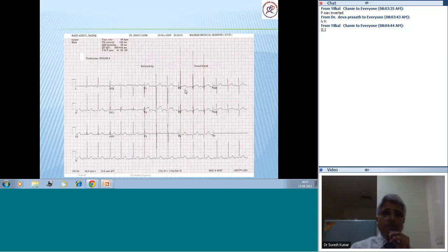What do you see now? You should try to respond quicker, because only then I'll be able to show you more number of ECGs.